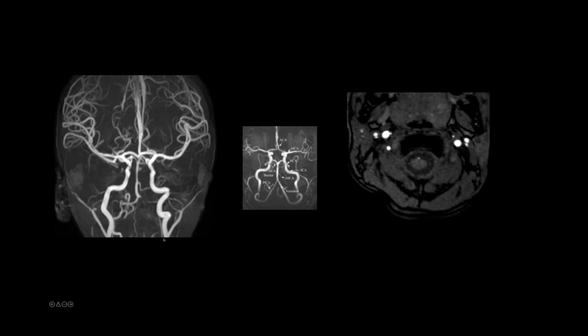This is the angio, and on the MIP images, you can appreciate that the left vertebral artery is not visualized. The PICA on the right also was not visualized. The superior cerebellar artery, which is this on the left side, is not visualized on the right. And also the ICA is not visualized on the right.